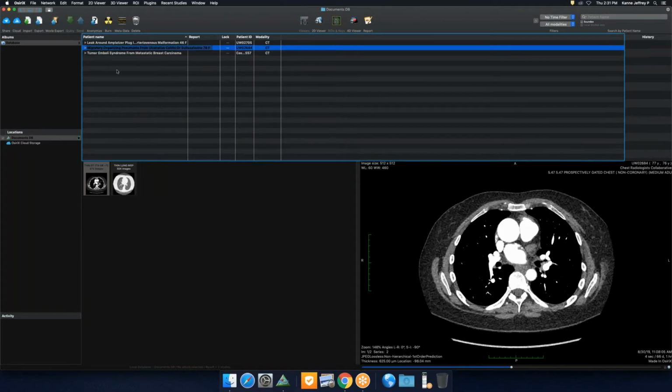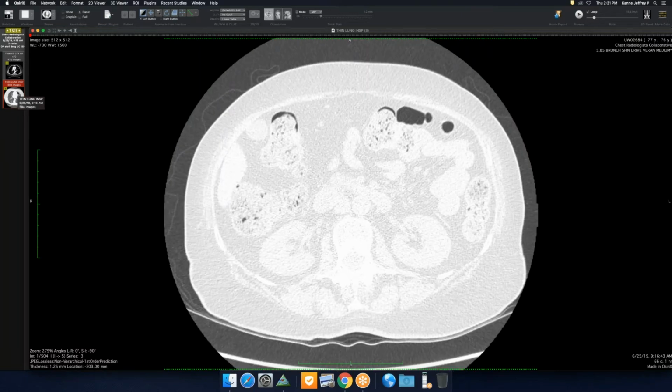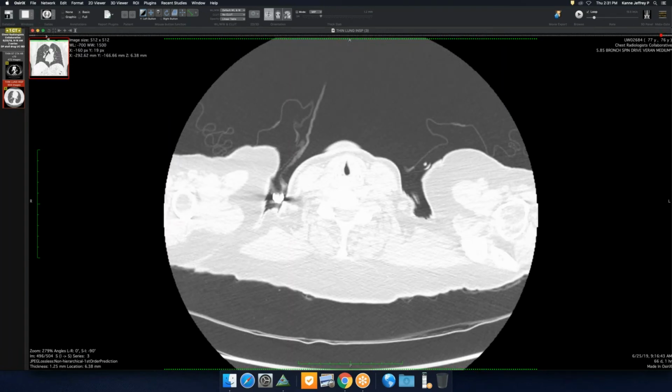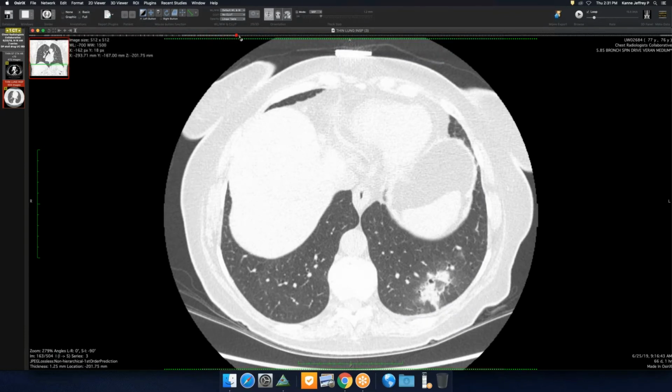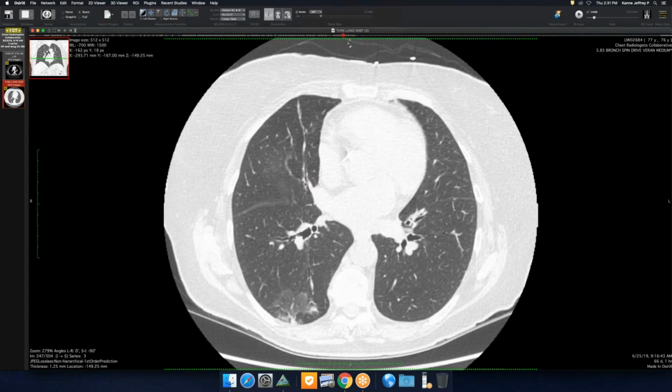And then this is just a really nice example of a patient who has ulcerative colitis, is on sulfasalazine, and developed some respiratory symptoms. It's one of the prettier examples I've seen of migratory organizing pneumonia. So you've got nice atoll halos. I don't think there's any question of what the diagnosis is.